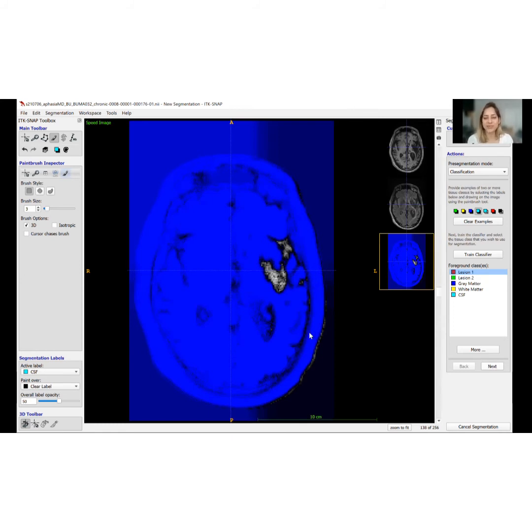And get to the cool part. The cool part. Yeah. The fun part. The fun, like the bubbles. The bubbles. Chewing. So this is the part where, depending on the settings that you've chosen, it may take some time.